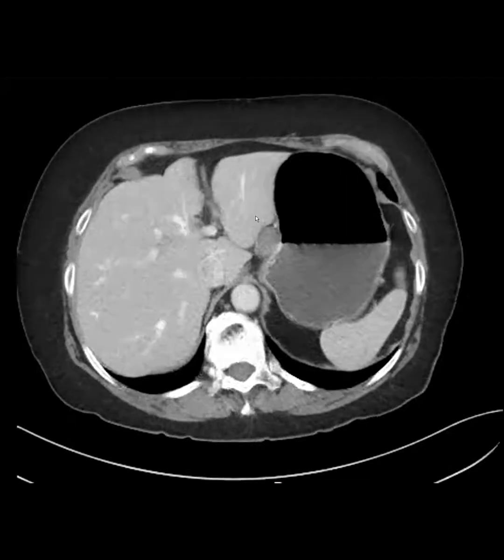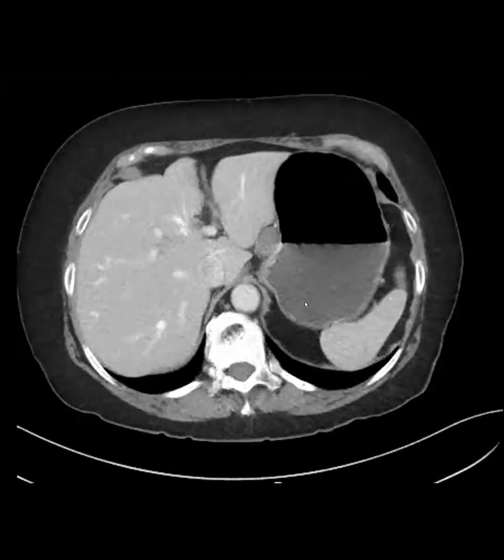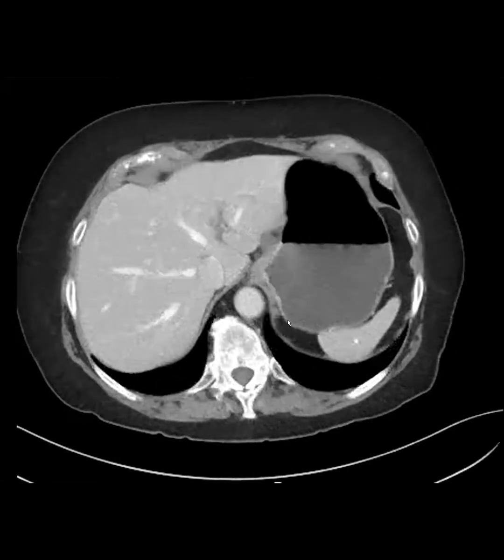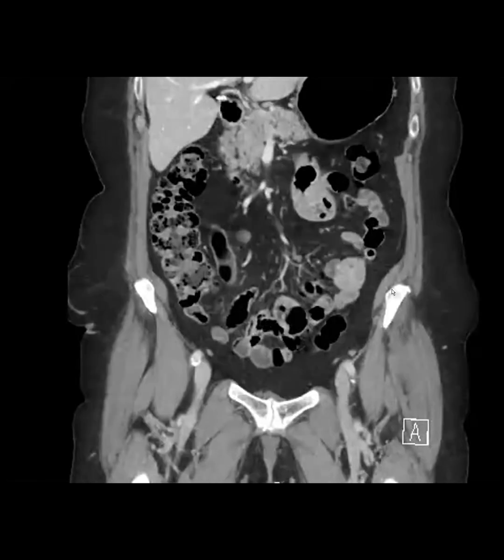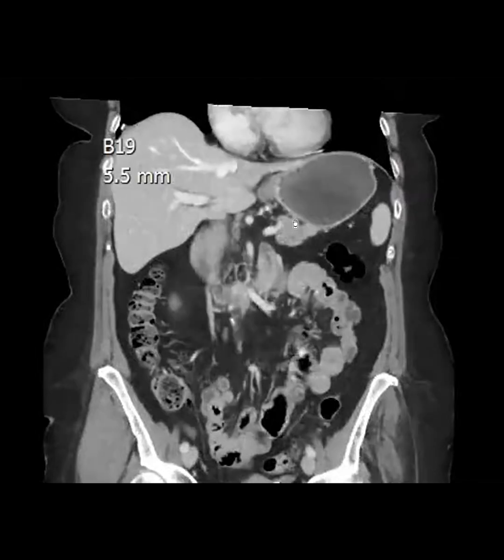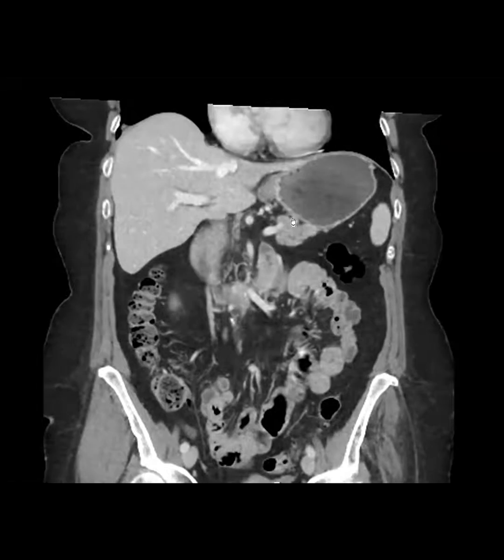So what do you think this lesion is? It's like a gastrohepatic node or something. It doesn't have a broad base of contact with the serosa. To me, it looks more extragastric. It's hard to tell. Even though you have great distension here, it's still unclear if this is arising from the wall or just adjacent to it. Things I'm thinking about are leiomyoma, and then, like Nelly said, a lymph node. Okay, there I can see that maybe it's subserosal because it has a more broad base of contact. Yes, that would be my first thought as well.